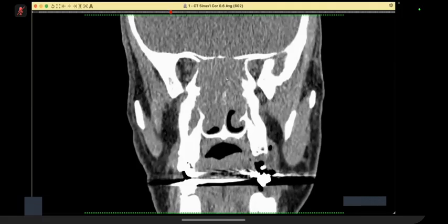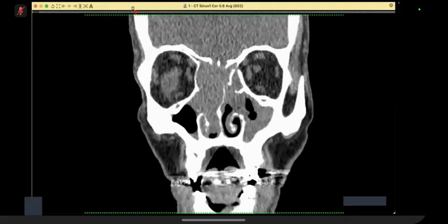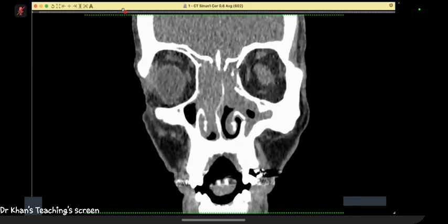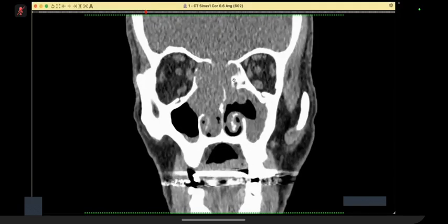So this could be a carcinoma involving the nasal mucosa with extension and erosions of the bone. This could also be a chronic polyposis. However, in that case, that would cause a rarefaction and not erosion. Another differential would be... I'm going to look at the OMUs again. Okay, I don't think that this is an inverted papilloma. In my routine practice, I would also look at contrast enhanced sections to look for any contrast enhancement.